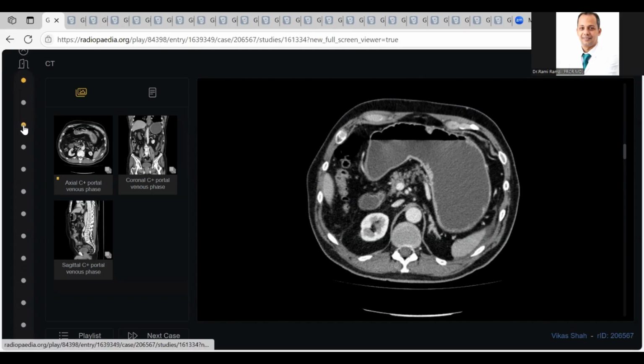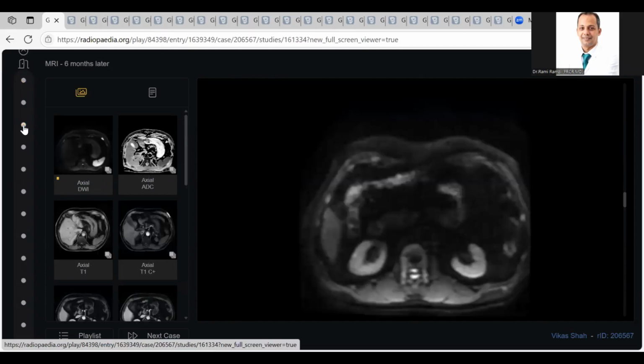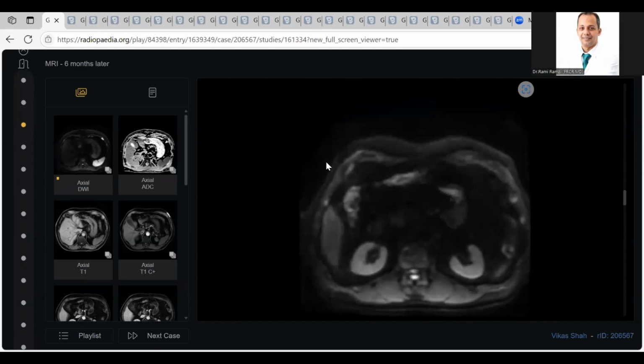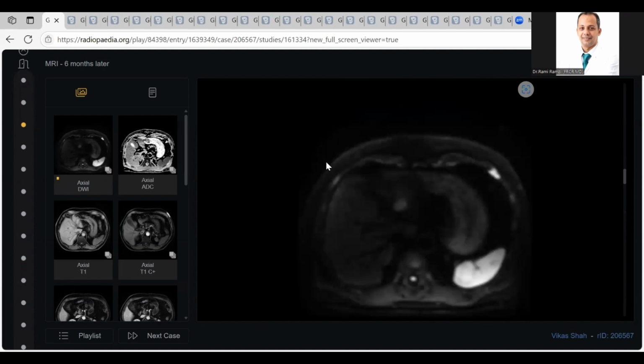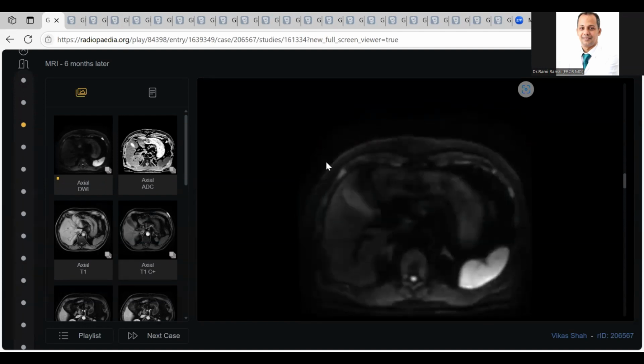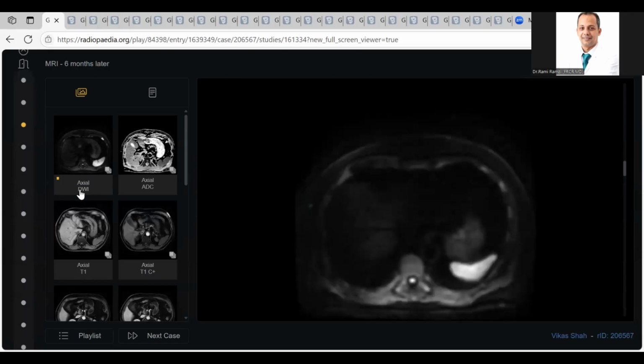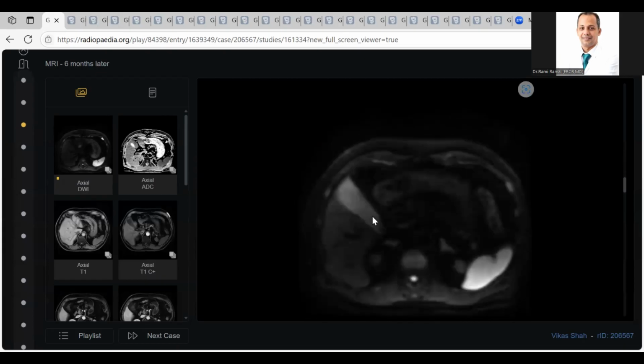Next candidate. Assalamualaikum, sir. Doctor, this patient, the same patient, we did an MRI. Okay, this is the MRI. Shall I scroll for you? Yes, sir, please scroll for me. So these are axial sections of the MRI T2-weighted sequence. This is not T2, doctor. So there is a fat suppression of the pancreas due to the lipomatous infiltration.